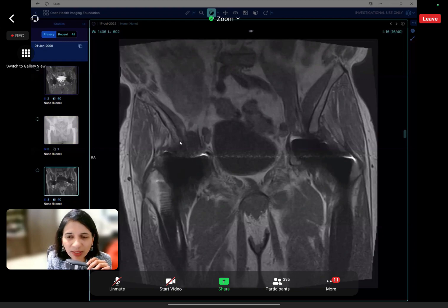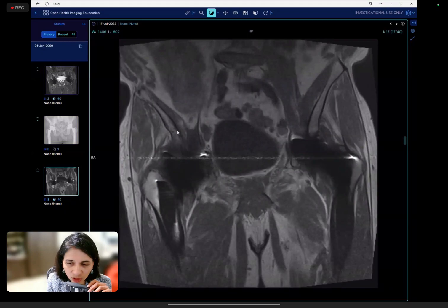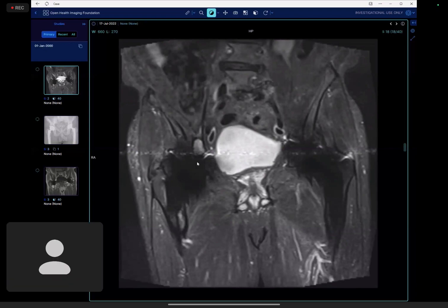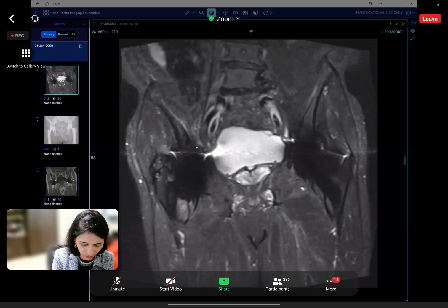This is an example of a big pseudotumor. But it is something that you need to recognize, that you are looking for on the MR: any fluid collection, any tumor-like mass, any changes in the marrow with loss of the normal fat, which is replaced by granulation tissue, because basically it's an adverse reaction to the metalwork, isn't it? That's what is happening. Okay, fine. So I think we did those three cases.